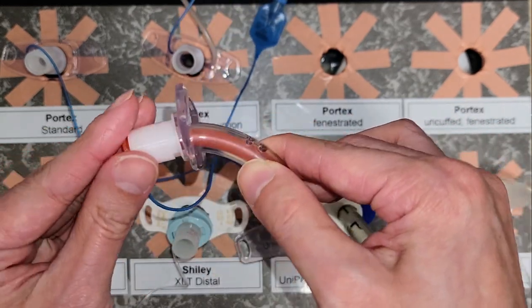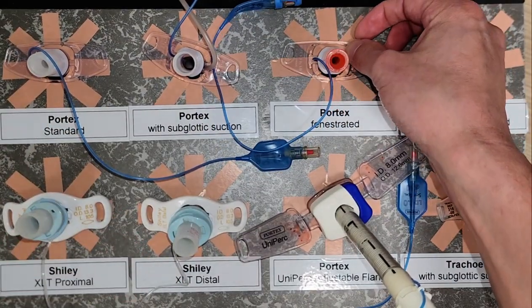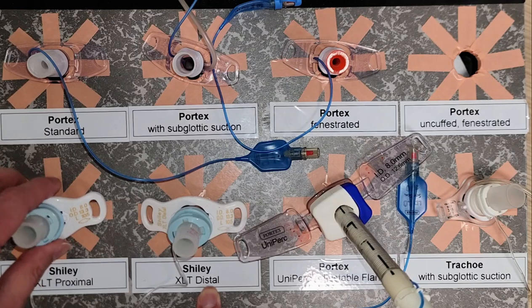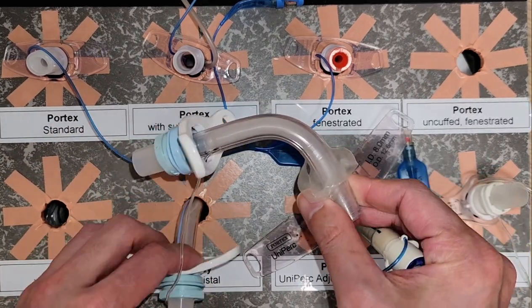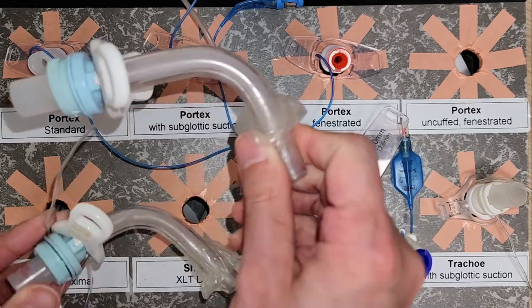There are also different lengths of tracheostomy tubes to cater to different size necks. For example, here we see Shiley XLT proximal and XLT distal. As you can see, both of these tubes are configured differently and provide different lengths for different types of necks.